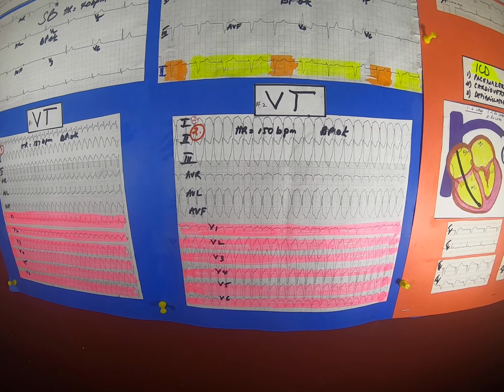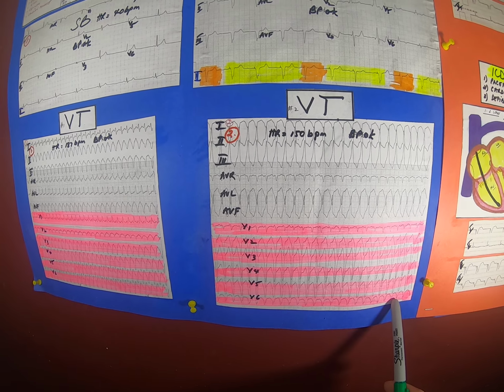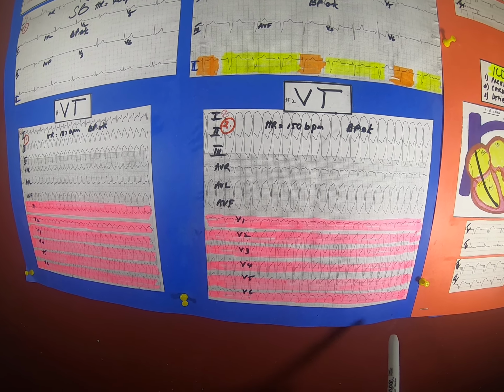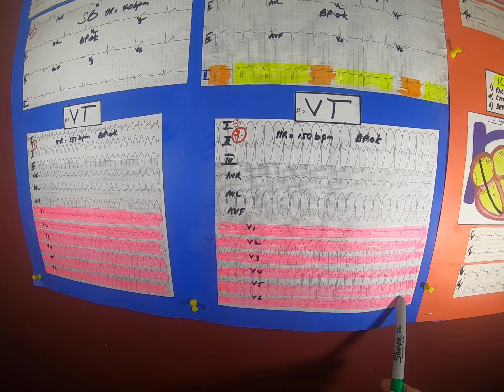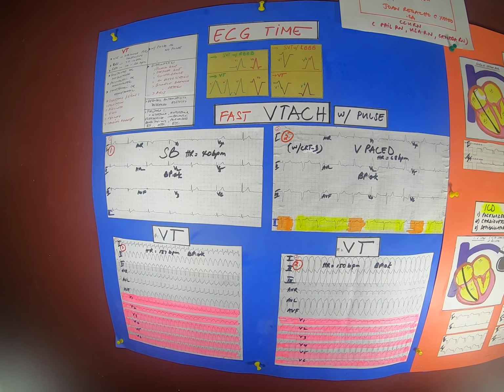The 12-lead ECG showed wide complex tachycardia, okay? And the patient is conscious, and there's pulse. So we're gonna find out, are we dealing with VTACH with pulse or SVT with bundle branch block? So let's take a look or review again the VTACH criteria.